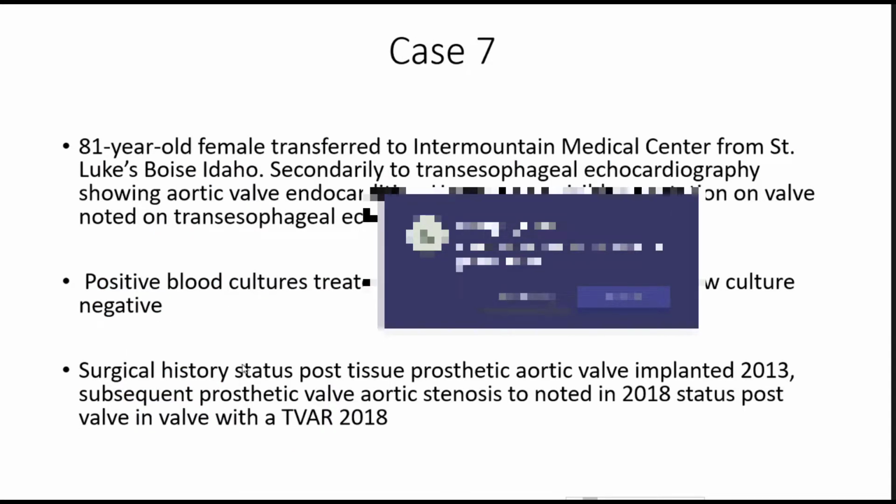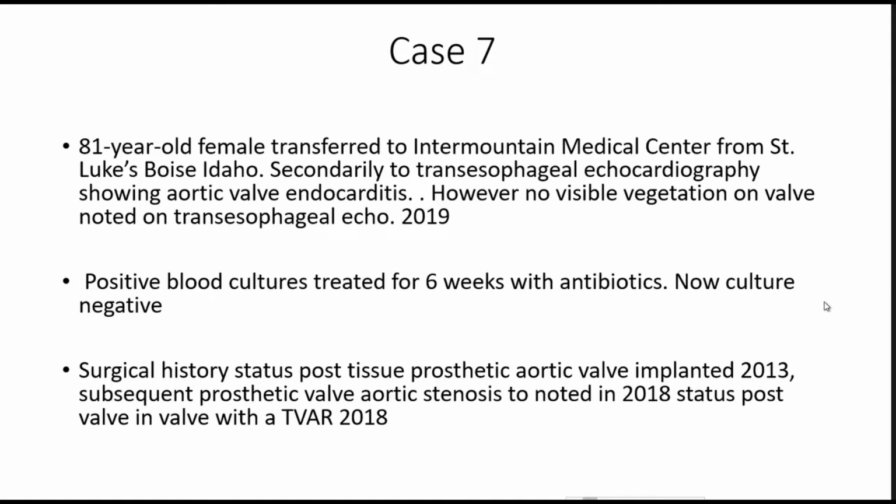All right, this is a very complicated, convoluted case, and to me it points out some limitations of our ability to image and the need for everyone to review previous studies.